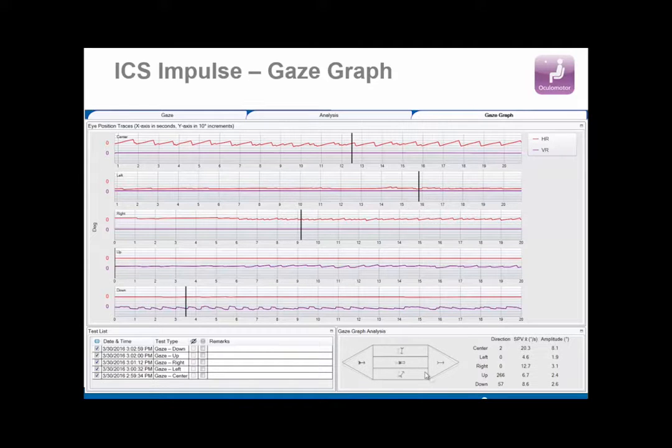And then the number of bars in that arrow and the number of tails in the arrow tell you the robustness of that nystagmus, the SPV value and the amplitude value. And then here shows you direction. Okay? And it's based on like 360 degrees.